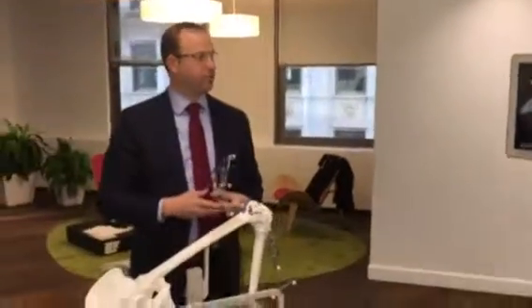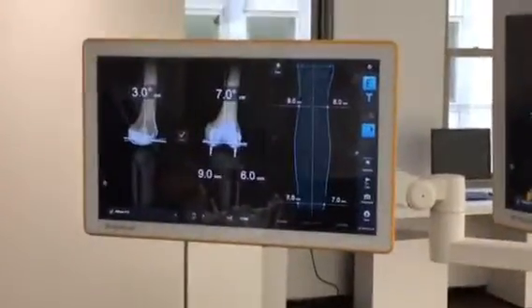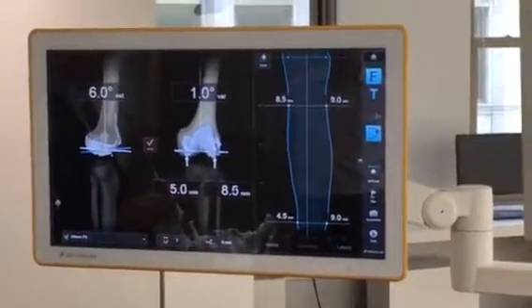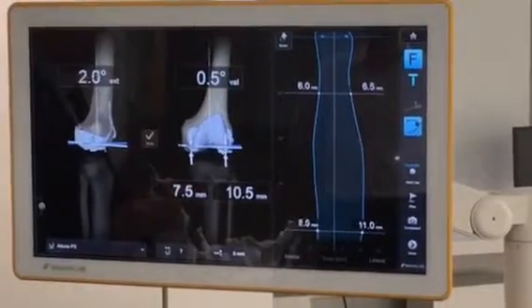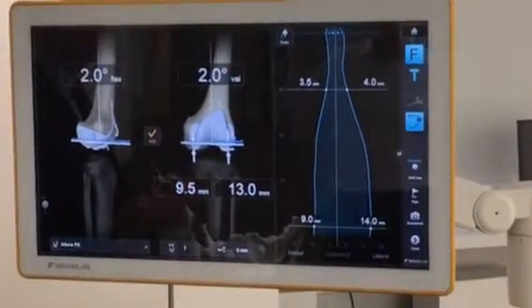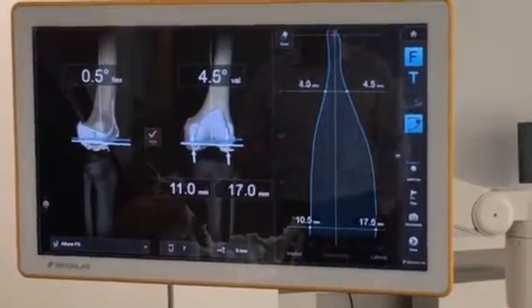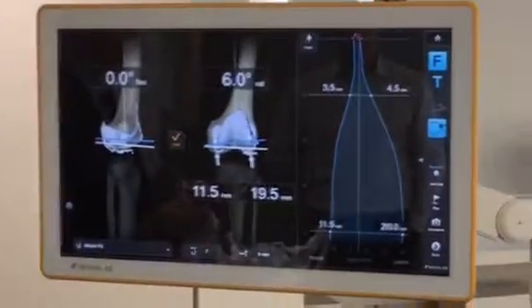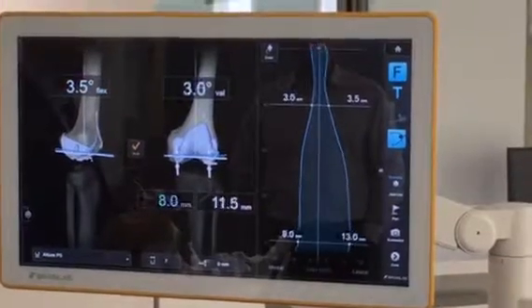In the femur, we know that a resection level, as we add it up, creates more laxity in extension. So here I am with a cut, and I want to go down to 0 degrees mechanical axis. And I want to put some flexion in here, so I'm just hand driving this now into flexion. But if I look at my resection level, as I take more, the bottom of the graph opens up, the extension, because extension is affected by the distal resection. And as I take less, the extension is affected.